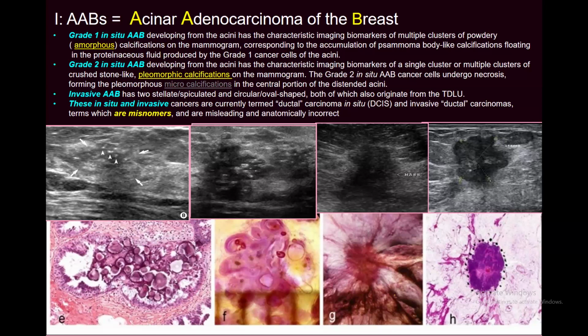At the end I advised to follow that small group of amorphous calcification because it can be DCIS, grade 1, or it can even be benign, like apocrine metaplasia or something like that. But the other side was the suspicious one, and it was proven to be a papillary carcinoma, the right one. I don't know what happened regarding the other one; they recommended a follow-up for her, and definitely after the war, nobody knows what happened.